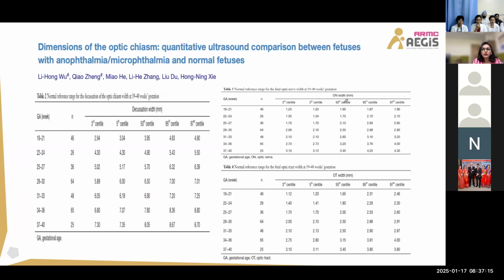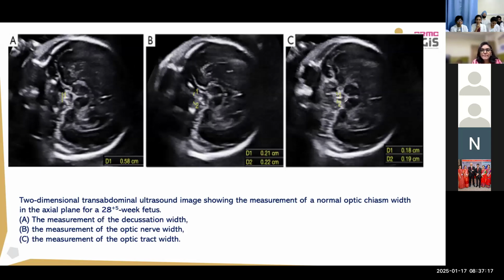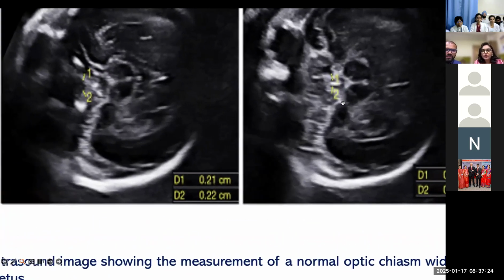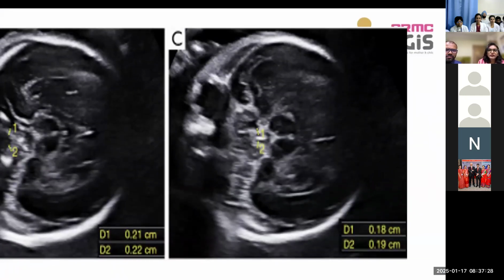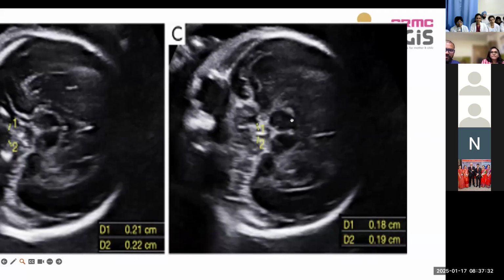Can you go back to the previous slide? I just wanted to see the optic tract. Can you zoom on that? Yeah, see. Okay. The posterior extension from the middle part, sir. So they simply appear. Okay, I used to mistake that as a bone, and only this part is valid. Okay. All right.